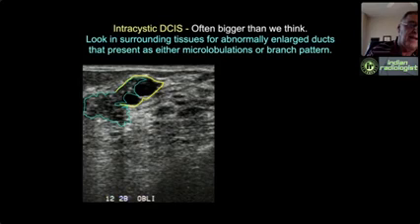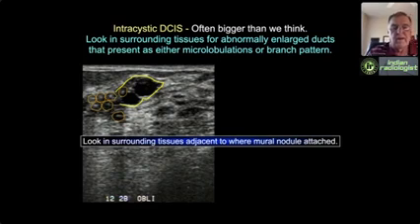So the amount of DCIS that's outside this cyst is much larger than the amount of DCIS inside the cyst. And notice that the classical histology of grade 3 DCIS is present. These are microlobulations, and inside microlobulation is a calcification. Where does that occur? In the necrosis in the center of the lumen. What is each of those microlobules? It's a single grossly enlarged duct filled with DCIS, central necrosis, and calcifications within the central necrosis.